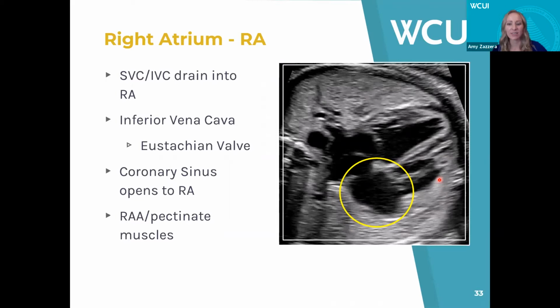And that is so important because a lot of these things we're not seeing in the four-chamber view. So the appendage is something that we can use as our marker to assess the morphology. Yeah, and that's really important. That's a great point because most people will say, you can't say there's an IVC draining to this right-sided atrium, so it's a right atrium. That's not always the case.